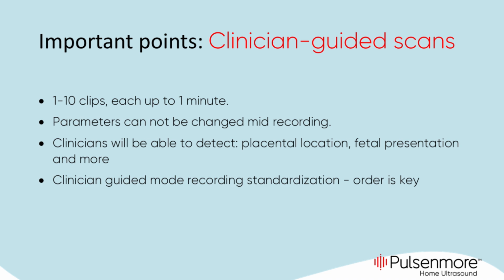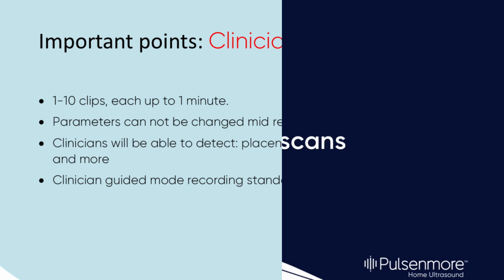We strongly recommend standardizing the order of recordings to help reviewers interpret the scans more efficiently. You may refer to the 5-step scan movement guide in the clinician manual. Now we can begin reviewing scans.